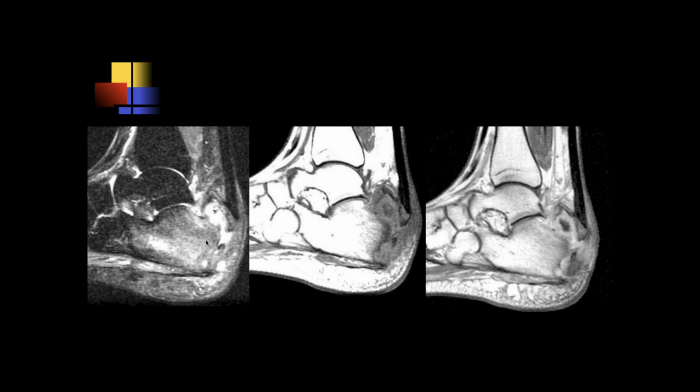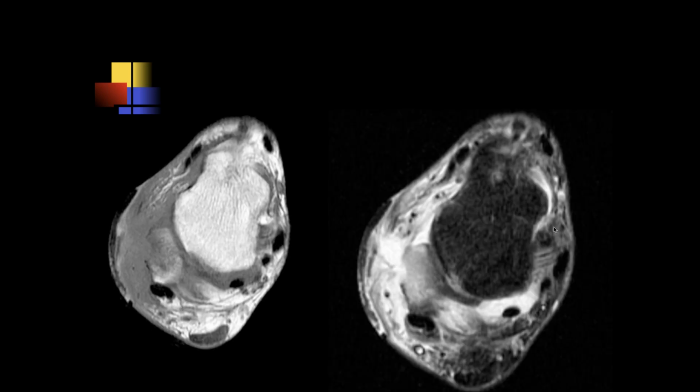This is someone who had calcaneal osteomyelitis, and it weakened the bone so much that then you got really a fracture of the calcaneus and avulsion of the Achilles tendon with a little bit of bone fragment coming off there. So this is another case of osteomyelitis and showing some of the complications you can get with osteomyelitis.